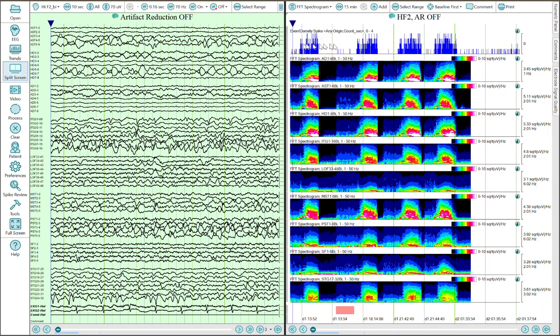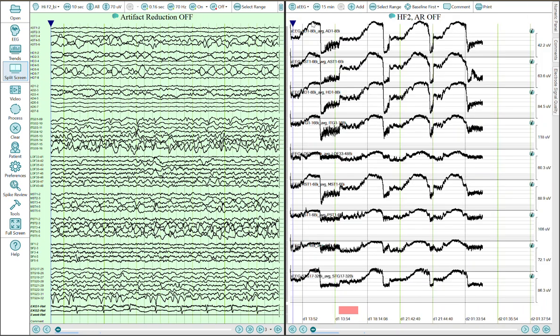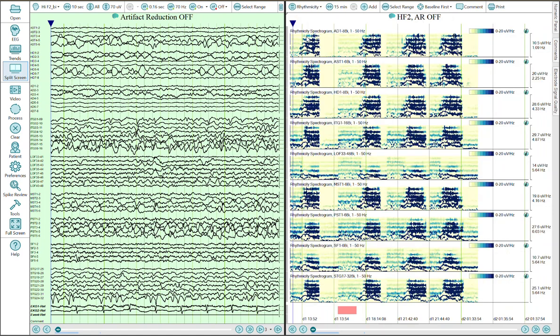We happen to have spike rates showing up at the top. We have amplitude integrated EEG, which is very interesting for intracranial for a number of reasons. Unexpectedly kind of handy. A rhythmicity spectrogram, which is helpful for looking for evolving rhythmic changes. This one's pretty straightforward. You have these series of seizures, which are predominantly spikes in the waveforms.